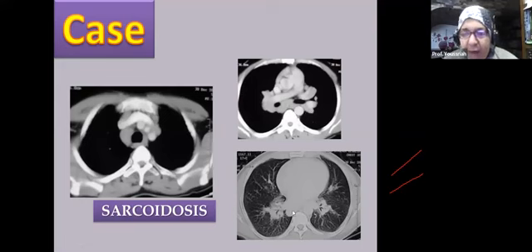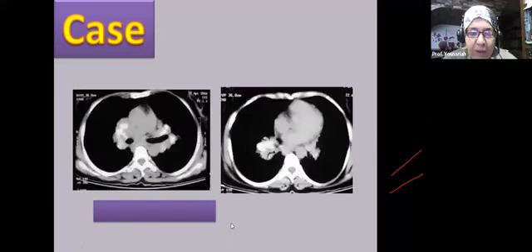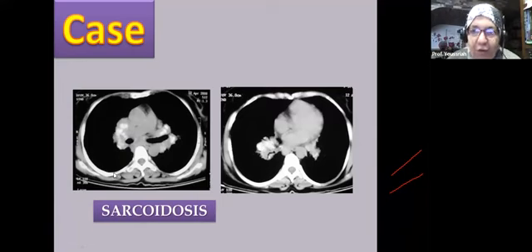affection. Okay. In addition, if you see the lung window here, you will see the hilar regions have a pattern that we call the parahilar opacity. The parahilar opacity, okay? This is another classic appearance of sarcoidosis. Sometimes the sarcoid is not typical. The sarcoid lymph nodes may calcify. The pattern of calcification may be punctate, dense calcification, or vague amorphous calcification, or rarely it may have an eggshell calcification. This is a case of sarcoidosis.